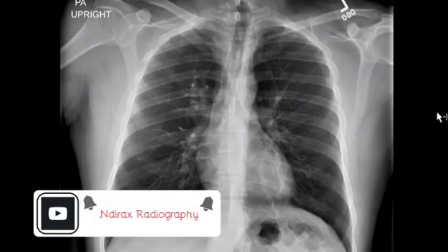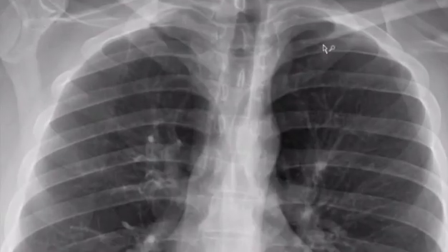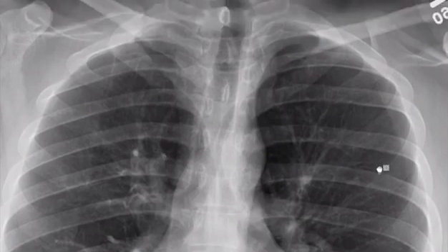Radiograph. I guess they could be sitting down, but this patient looks well enough that they could probably be standing during this one. So the next thing I do is go straight to the lung apices. I'm trying to rule out a pneumothorax, as that is one of the most important things you can see on an X-ray. So what I do is I zoom in real closely to the lung apices. I make sure there's no fine linear pleural line up here that would indicate a pneumothorax. There isn't on this patient.